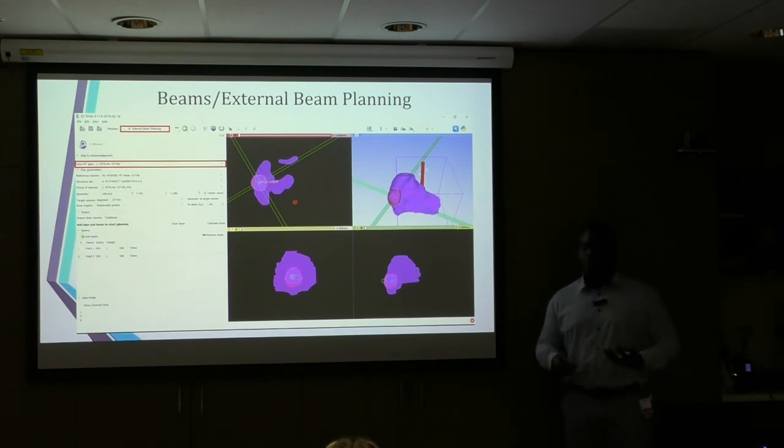But Slicer in its current form is unable to load up particle therapy plans, ion plans, and it's not able to do intensity modulated proton therapy. I tried to work with the guys from Slicer to develop the source code to add that feature to Slicer, and it turned out to be a very, very big task, and I had to leave it. So this particular module will do very simple 3D conformal plans.